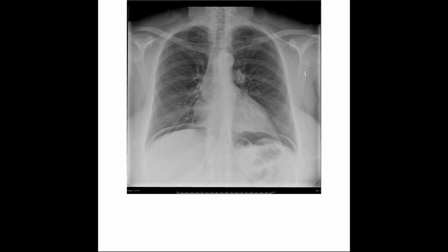Another way of putting the question is, what could be the other causes of air under the right hemidiaphragm? Chilaiditi syndrome is good, very good. I hope everyone else knows of Chilaiditi syndrome. See, duodenal perforation is equivalent to pneumoperitoneum. I'm asking anything apart from that. So for air under the right hemidiaphragm, one cause is Chilaiditi syndrome, which means that the colon is there, right, just beneath the diaphragm. That is fine. Hepatic abscess rupture, unlikely, because a hepatic abscess will not have air inside. Laparotomy, possible. Anything else?